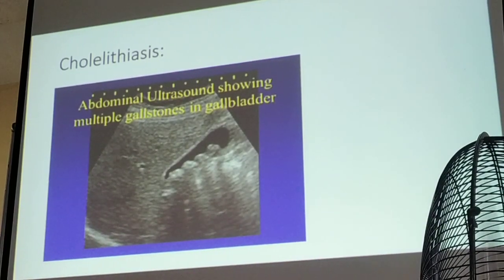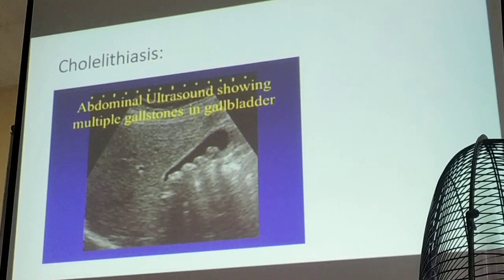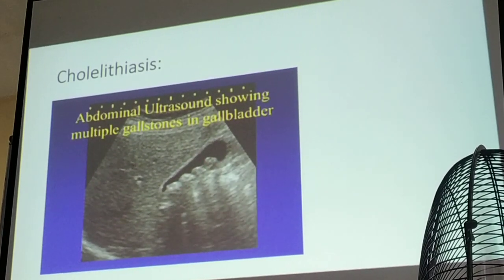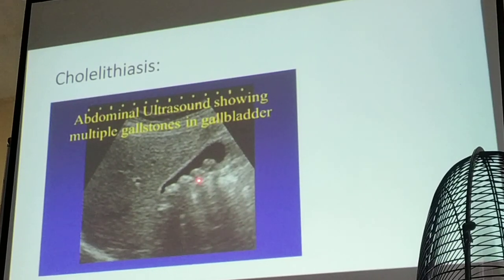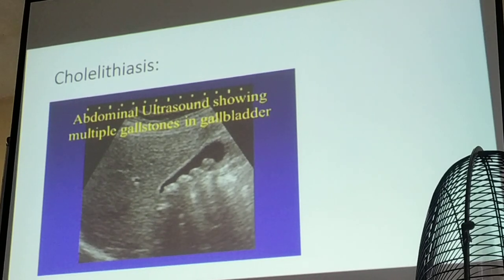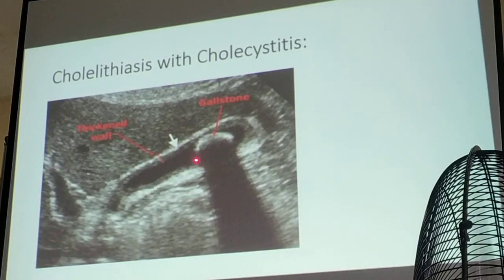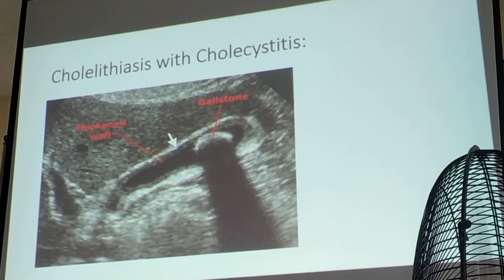Definitely, I'm going to give you a gallbladder stone. Okay? So, this is your gallbladder. These are the stones. Okay? Your clue here is the posterior shadowing. There would be black shadows going below your stones. There you are. You see that? So that would be your clue.